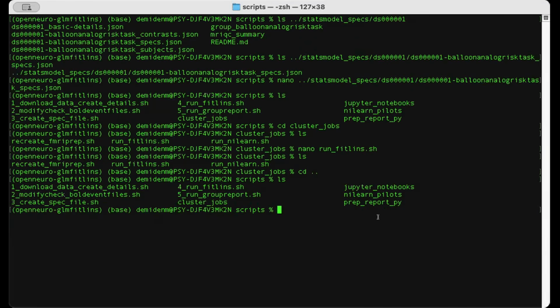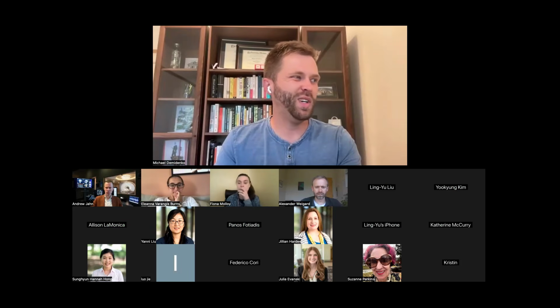It's 5 scripts, and the most involved are modifying the events files and your spec file. The rest it just does dynamically. Except, well, I guess I'm lying now because I just showed you an example where it didn't run. So it's not dynamic if it's failing, right? So bite my tongue on that. But I'll now show you an example of what these reports look like when you actually finish running them. But ask questions because I know we have 7 minutes.